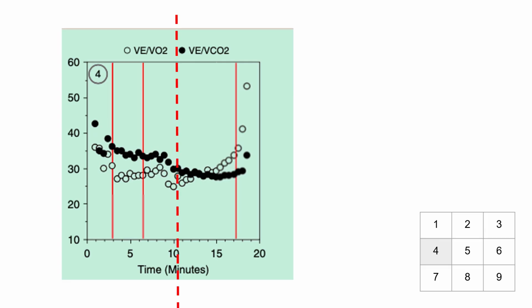This red line and pink arrow show the nadir of the VE/VO2 and identify the anaerobic threshold, or the VT1, and this is where the ventilatory drive starts increasing relative to the VO2 because of this excess VCO2 from anaerobic metabolism, usually around mid-exercise, and this is the start of the period known as isocapnic buffering.